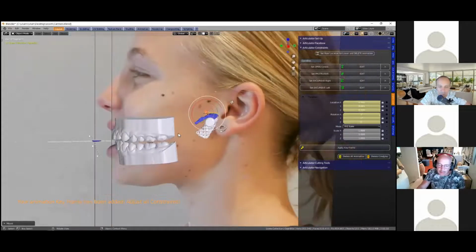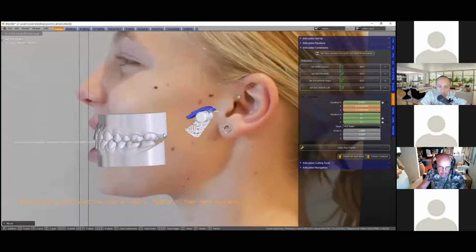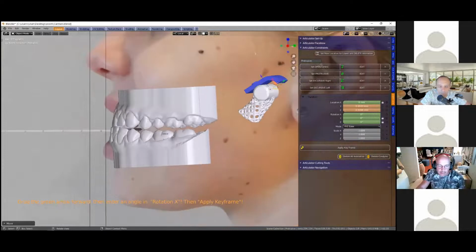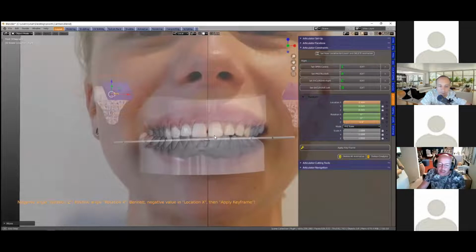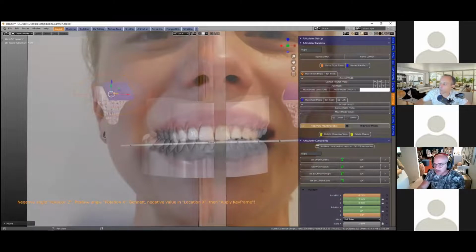It's going to bring up a little arrow here. Move the jaw forward like that. And we can then open it up a little bit like that. Apply. Set the right side. And shift. We'll just put the Bennett side shift of -1. And we're going to move this jaw. Okay, so here we could hide the photos so we can actually see what's going on. So just go to hide photos.